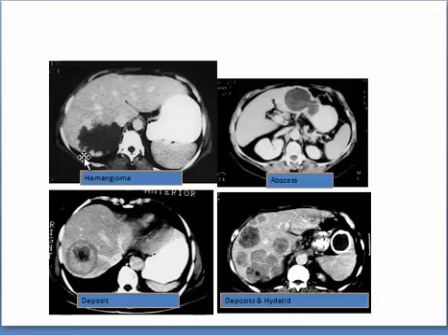This one with nodular enhancing wall, so it is hemangioma. This one with extension and enhancing capsule, more with abscess. This one is bull's eye or target sign, more with deposits. And these are for differential diagnosis, likely deposits.